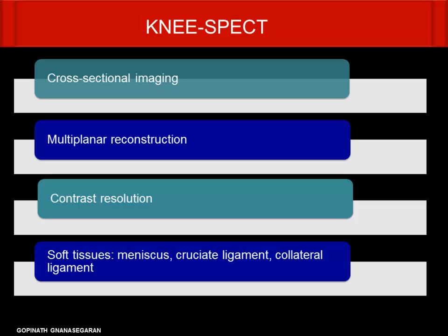I used to believe this, but if you look back at the images from the 90s and even the 2000 era, we were just going on pattern recognition. If it is half-moon shaped or half concentric, we used to say it's a meniscal tear, and often we used to label quite a lot of normal findings, because everything around the knee joint we took as a degenerative disease. But SPECT CT can help us to delineate, differentiate and give a definitive diagnosis.